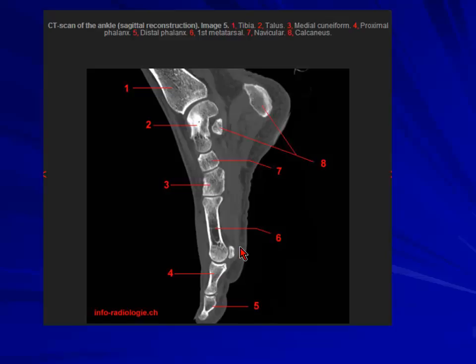ladies who wear high heels are prone to these degenerative changes with hallux valgus, the deviation of this joint towards the lateral side, so this becomes prominent. There is thickening of the bone, and sometimes it gets inflamed, and then this causes bursitis and causes inflammation of this bone. You need to be aware whether this is inflammation or there is a fracture.